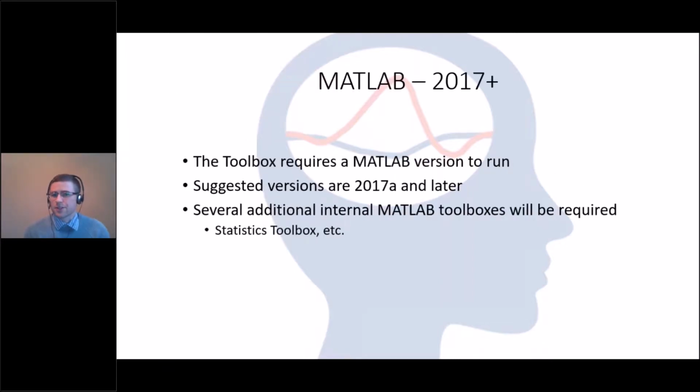In running the toolbox, we do suggest using at least MATLAB 2017 or greater. There are consistent updates with the toolbox. Dr. Huppert puts these out regularly. You can actually get a GitHub account for the toolbox and periodically update.